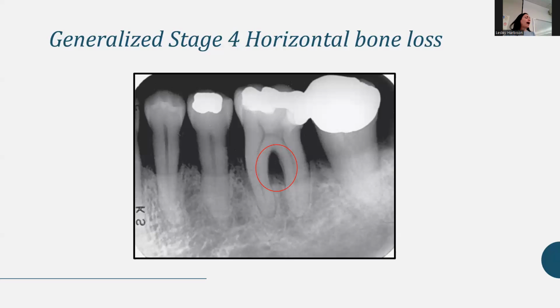If you have active periodontal disease, you're really always prone to it, so you have to be very careful. You stay at the stage because you lose that bone level, but then you would just control it. Yes, stable. The gingiva is healthy and firm, there's no bleeding upon probing, but there's still all this evidence of periodontal disease.